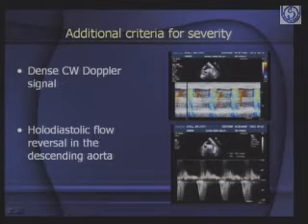So we are showing you the picture here of where the beam is placed, and this actually shows you the systolic envelope, and here is the diastolic envelope. So mind you, you have to be pretty good at knowing which way the flow is going to get to know about flow reversals.